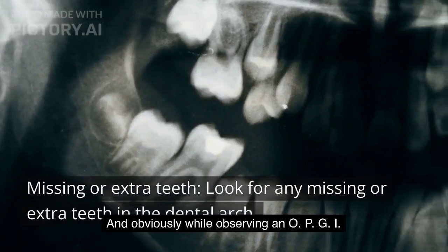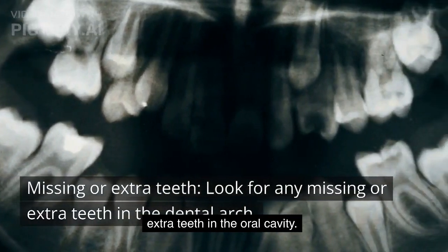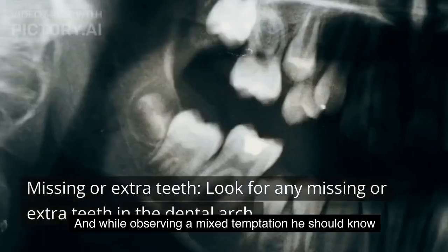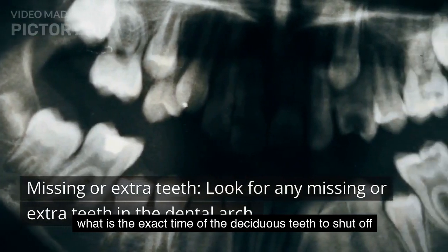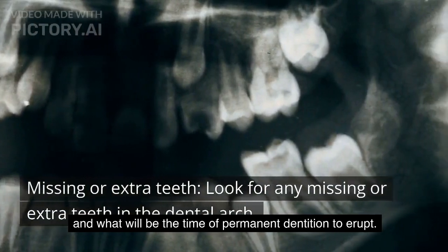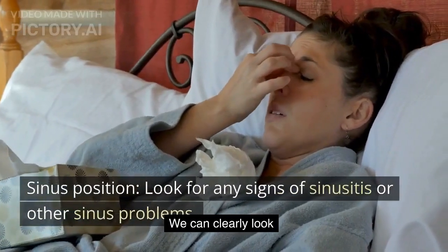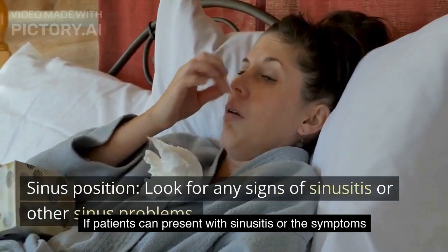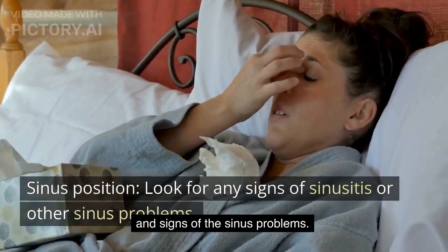And obviously, while observing an OPG, a dentist should know the missing or extra teeth in the oral cavity, and while observing a mixed dentition, he should know the exact time for the deciduous teeth to shed and the time for the permanent dentition to erupt. We can clearly look at sinus infections and pathologies if the patient presents with sinusitis or the symptoms and signs of sinus problems.